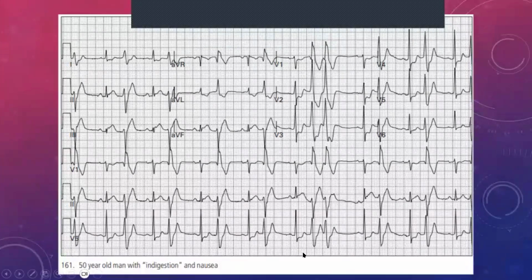Unless it's a protocol in your department and you have the capability to do an ECG for every patient, what would actually lead you to do an ECG on this patient is this odd bradycardia mixed with the tachycardia that you would probably see on your 3-lead ECG, where you would see a similar pattern to this. And then that would lead you to say, okay, let's have a look at a full ECG.